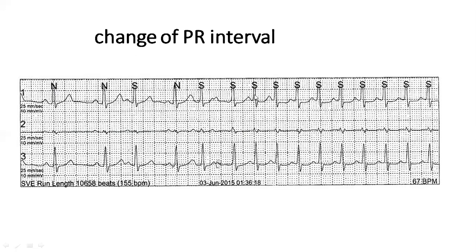So how does this tachycardia start? You have three things here. You have sinus rhythm ectopics, you have a tachycardia, and you have this transition zone where you see an atrial ectopic starting the tachycardia with a long PR. The tachycardia is a regular, narrow complex, short RP tachycardia. Can we tell this on this ECG, on this Holter, or not? On this Holter strip, how will you describe the onset of the tachycardia and the tachycardia itself? A narrow complex regular tachycardia, short RP, initiating with a PAC with a long PR interval, right?